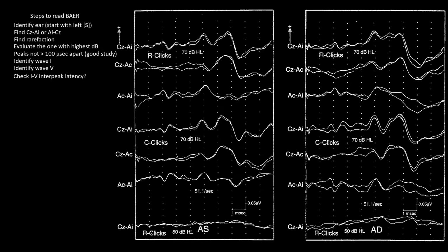As you can see, I have transported these items, that is the items that you have just read, from the master chart to the side of this frame that also has the panels presented in the question. So let's start. The first step is to identify the ear to be analyzed first. Most electrophysiologists start with the left ear, which happened to be the one addressed in the initial question. Remember, S stands for left.